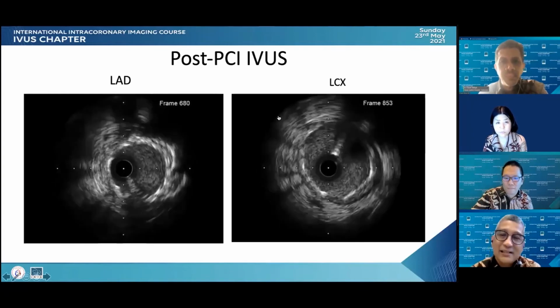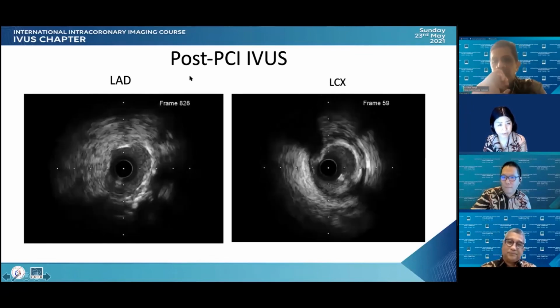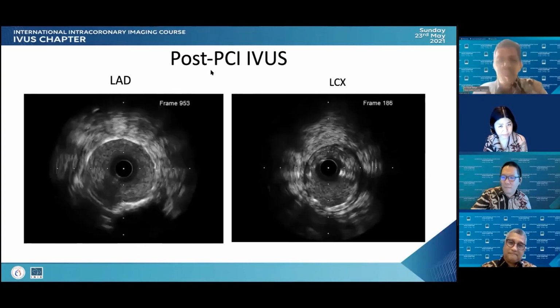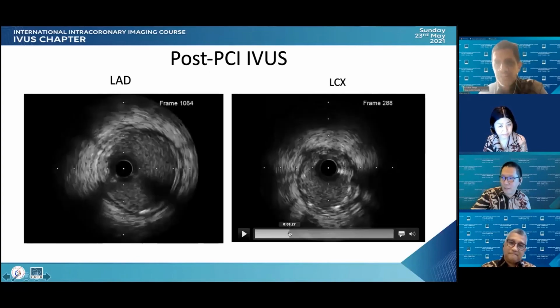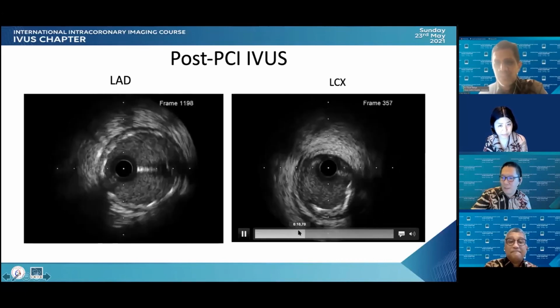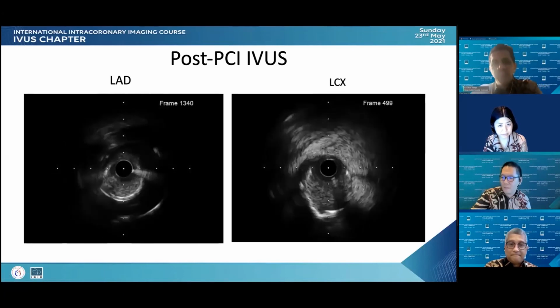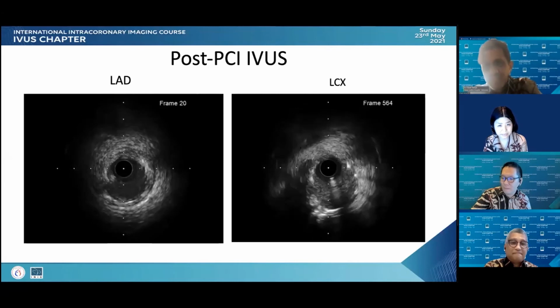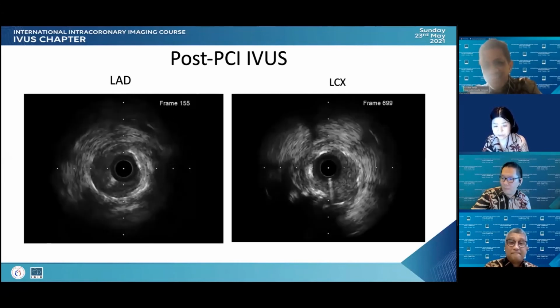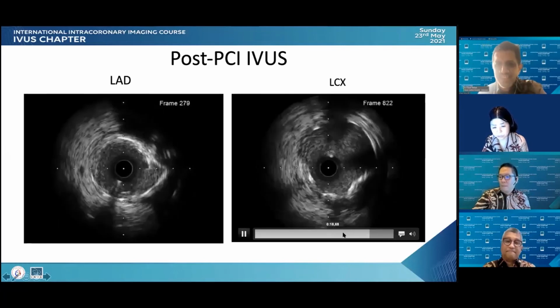Okay, one thing which you commented is a very important thing. I believe you said somewhere not covered by the stent. Is this correct? Yes. So you recognized somewhere, even with the two-stent technique, was not covered by the stent. Wow, that's really good. That's actually the question of this picture. It's a little bit advanced IVUS picture.